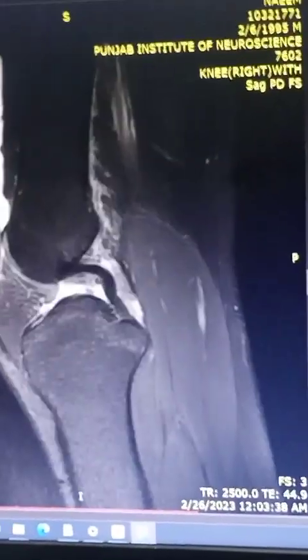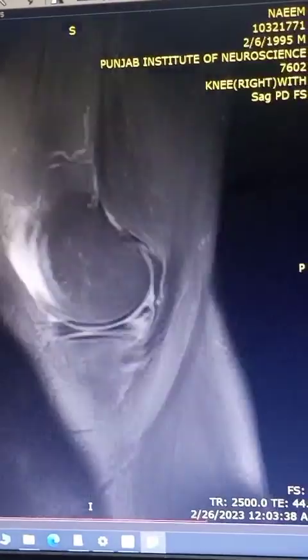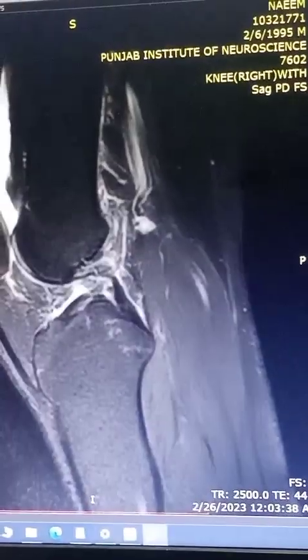So that's a brief overview of our MRI knee anatomy. We have taken a gross look at the main structures that we look at daily.